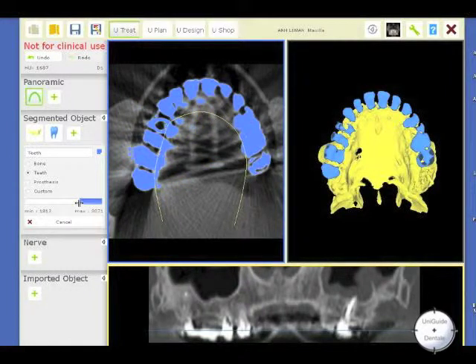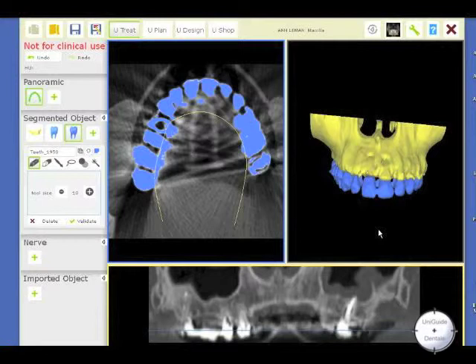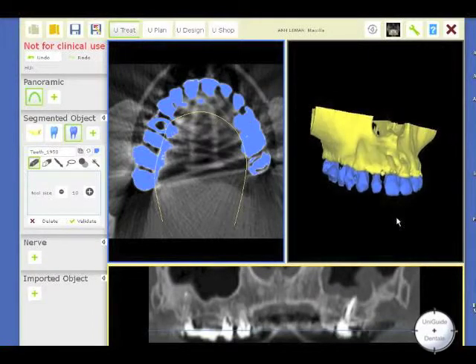I go, let's say, to 1019, shift, click, click, click, click. I click all over, and I get a new mask. This mask is not so bad, it is better, so I decide to keep it. And you see in a very short way how I've been able to clean my scattered images.